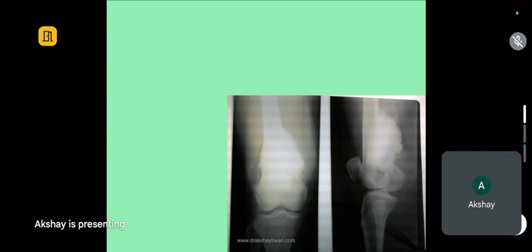The tumor shows an osteoid matrix with a large soft tissue component, mainly on the medial and the posterior aspect, also involving the femur eccentrically. You can say eccentric because there is no anterior part, so posteriorly it is eccentric, right? The tumor shows whatever zone of transition, whatever pattern of destruction, with the soft tissue component and whatever periosteal reaction.